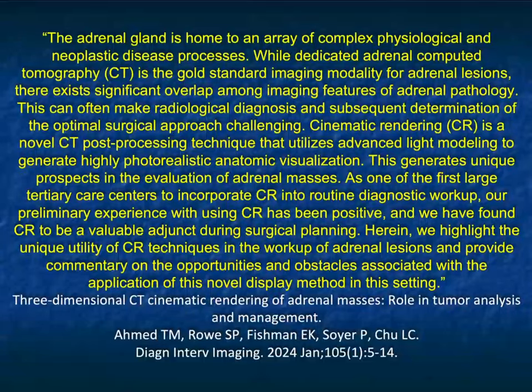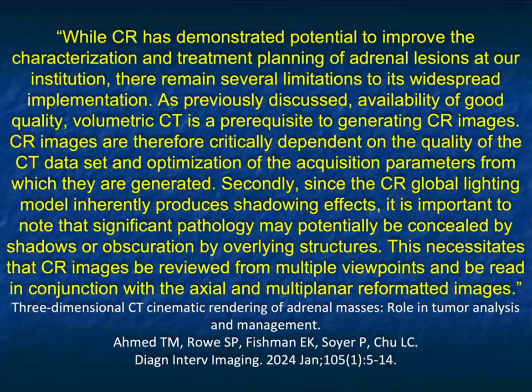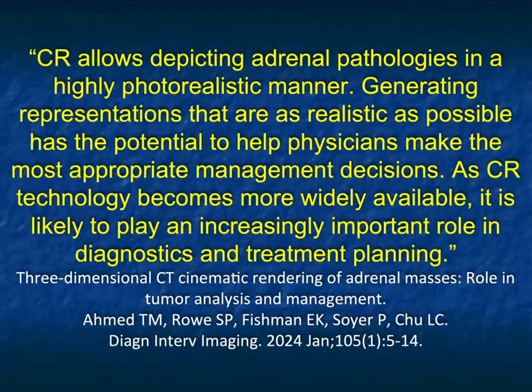And when you think about it, we are looking at a number of different possibilities with cinematic rendering. I'll speak later about lymphoma, how lymphoma has somewhat of a classic appearance. We'll talk about things like ACC and how cinematic rendering gives you a better feel about vascular involvement. But again, perhaps we're going to learn more about adrenal lesions by looking at their 3D. And cinematic rendering has demonstrated potential to improve characterization and treatment planning of adrenal lesions at our institution. But there are several limitations. There is some overlap. There is some user learning process, and it does take a little bit of time, but I think it's well worth it.